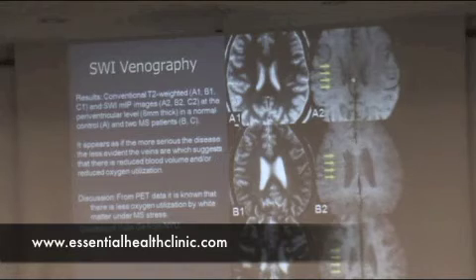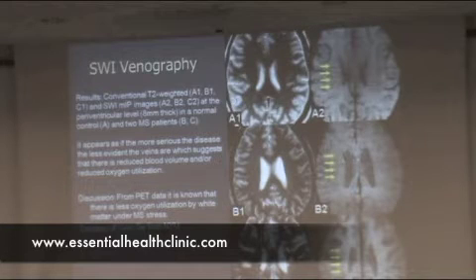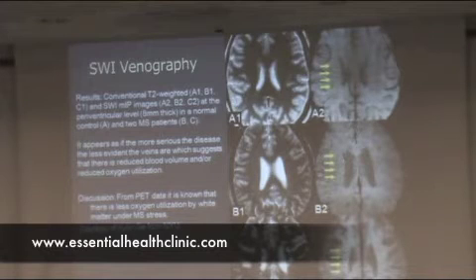And here's this perfusion example I was alluding to. If we look at these medullary veins that can be seen very nicely in a normal person, in someone with relapsing remitting MS, you can still see them, but maybe not quite as clearly. Someone with more progressive MS, it's hard to find them. So the question is, what's happening here? We should have seen them better, like in the caffeine example.